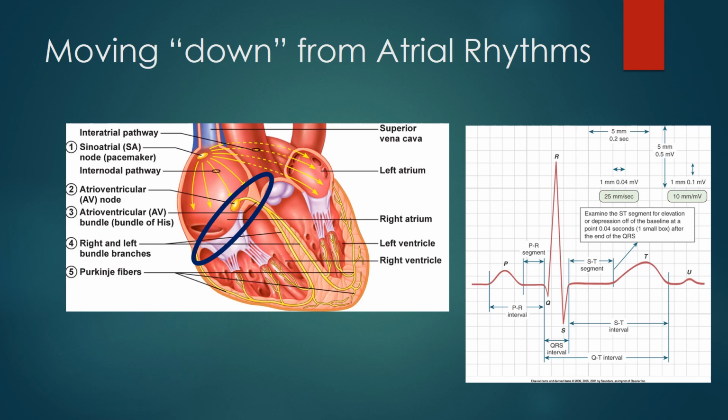So how does this translate into the PQRST complex? Well, we're now looking at the PR interval. And now because some of the rhythms will impact the atria, you'll be assessing the P wave as well. And you'll even see how this might impact the ventricles.